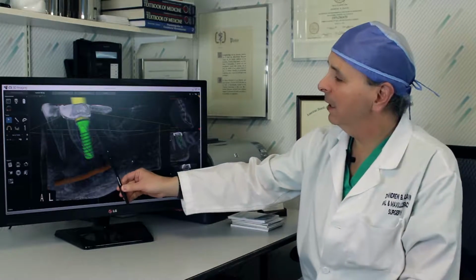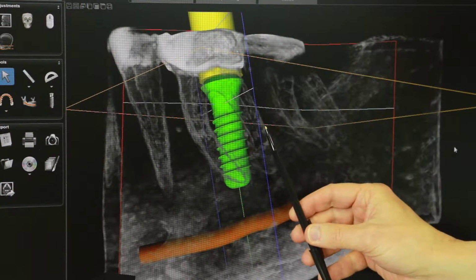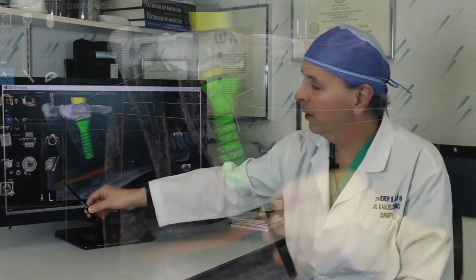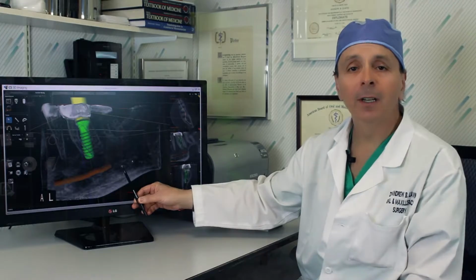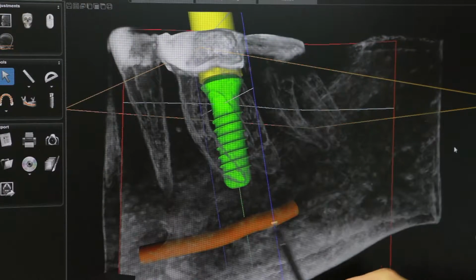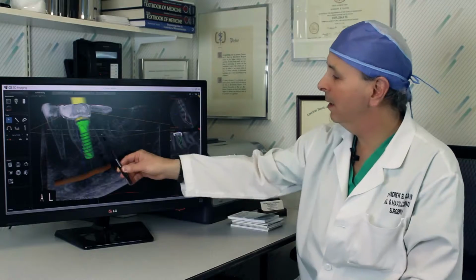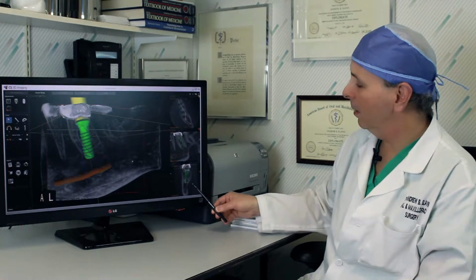And as we can see, this tooth is a problem tooth that needs to be removed, and this implant can be placed virtually on the screen. The nerve which runs through the jawbone, that's actually numbed when you have a shot of Novocaine that makes your lip numb, is a critical structure that the implant has to be shorter than, to allow you not to have damage to that nerve. We can see this implant in 3 dimensions, as we can the tooth and the nerve.